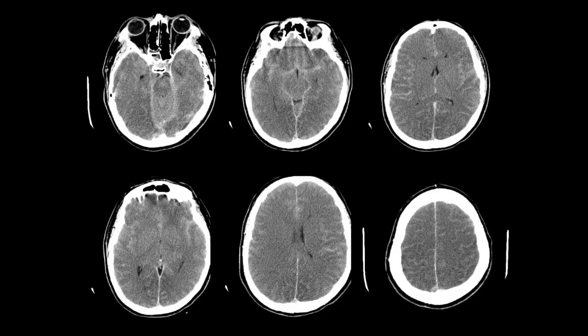But if you look at this case a little bit more carefully, you can see that it's very hard to differentiate the basal ganglia. Perhaps you see them a little bit on that slice, but here it's really hard. You don't see a lot of the gray-white matter differentiation either. And so that should kind of be a red flag that you may not be dealing with subarachnoid hemorrhage. Perhaps the problem is not the bright stuff in the sulci. Perhaps the problem is that the brain tissue is too hypodense. And that was the case for this patient who was victim of a cardiac arrest.